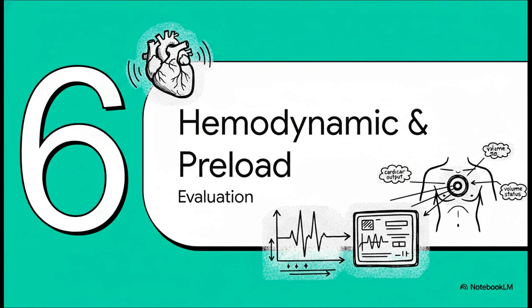And for our final section, we're going to use TEE as a true hemodynamic monitor. This is where we take all these images and turn them into hard numbers that can guide your management of fluids, pressors, and inotropes, minute by minute.